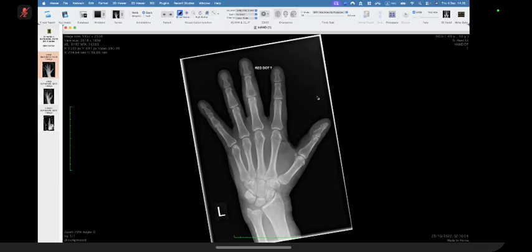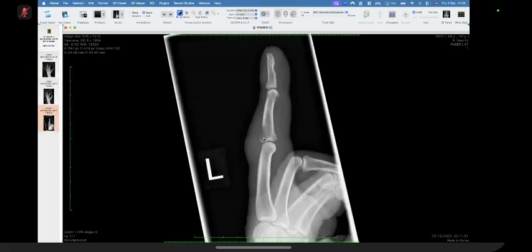You were absolutely confident this is a chronic pathology. This is anything but chronic. There is intramedullary signal change, there is periosteal reaction, there is scalloping of the bone, but the bone still looks very irregular. So this is anything but a chronic process. It may still be chronic, but you cannot completely exclude an acute or more recent pathology. This patient has come in with a 2-month history of slowly progressive swelling. Yes, it could be tenosynovial giant cell tumor of the tendon sheath, but you have to keep other differentials in mind. You have to keep some sort of bone tumor in mind. You have to keep some sort of infection in mind as well. You never mentioned infection or any other thing.